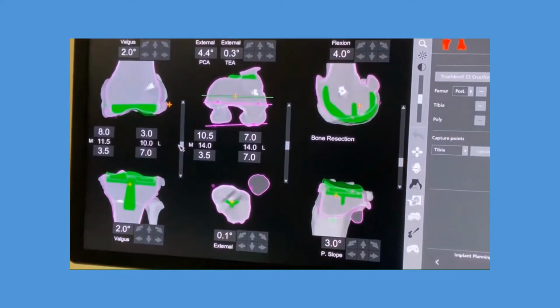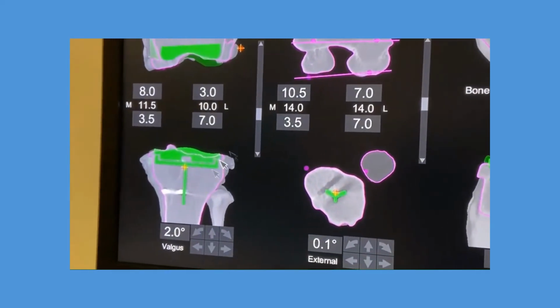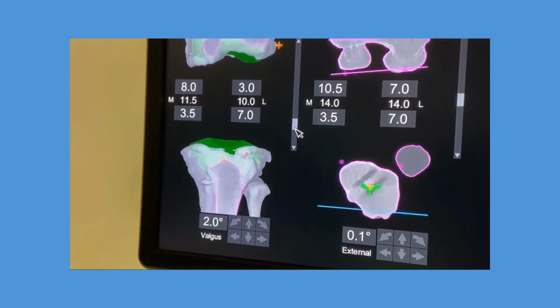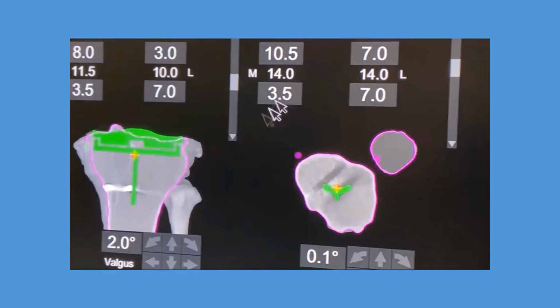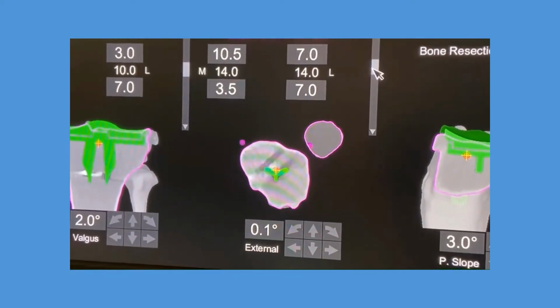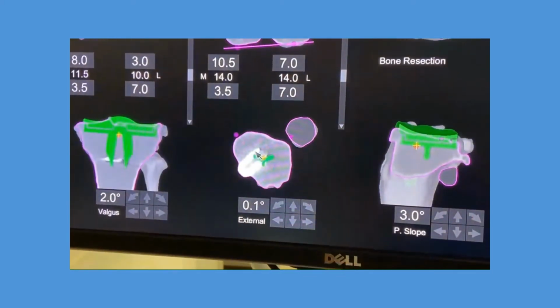On the other hand, if we look at the tibia now, we're dealing with a different picture. So here's the tibia, here's the keel for the tibia, here is a staple coming in from the side. And we can see that staple hits right there at the keel. And then when we look axially, we look down the bone, I can see it right there. So this staple will have to come out because it's blocking the implant.